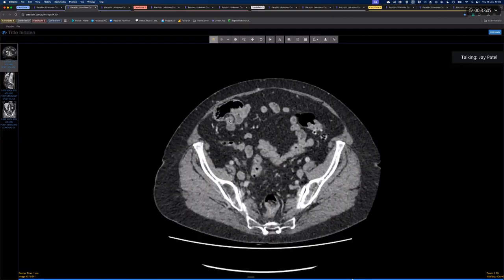Go up and go down. One of them will be a blind ending bit. That's your cecum. Then you can find the appendix off of that. Despite that, it can be quite hard to find an appendix for two main reasons. One, they've had an appendicectomy and the appendix has been chopped out. And two, typically in older patients, the appendix can become quite atretic, very difficult to see.